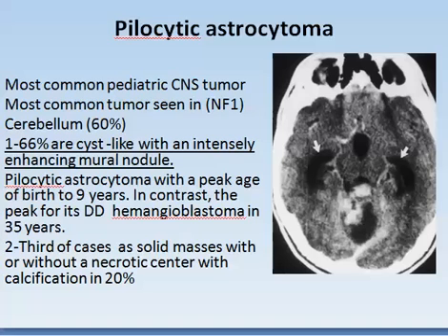Of course, hydrocephalus will be there, and this is to be differentiated from hemangioblastoma, which peaks at 35 years. 1/3 of these tumors is solid. Calcifications are minimal.